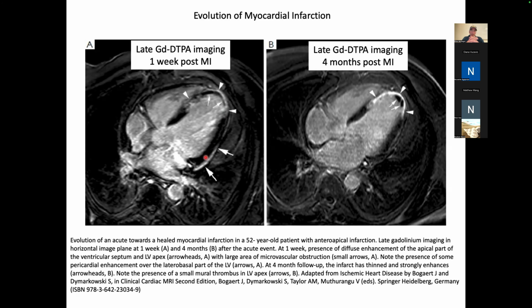So it's like hemodynamically stressed in that nothing can flow in there, right? It's completely blocked up. And obviously there's some middle of the road contrast here in the septum.